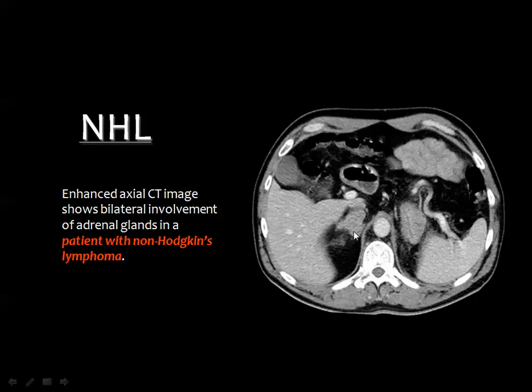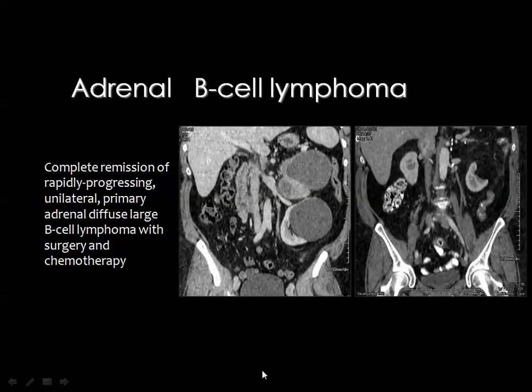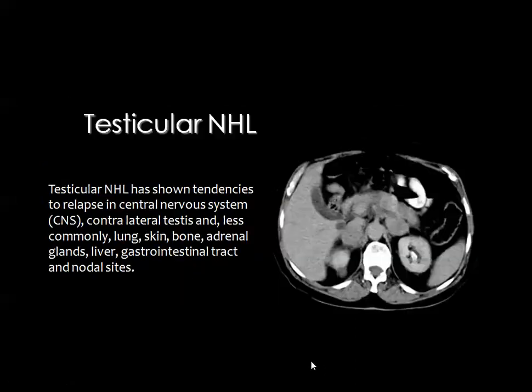And here you can see two bilateral suprarenal masses and the differential diagnosis. If you do not know that the patient had non-Hodgkin lymphoma, the differential diagnosis will include metastasis, pheochromocytoma, adrenocortical carcinoma, and so on. And this patient had an adrenal B-cell lymphoma proven by surgery. This is the tumor, and this is the kidney, where a simple renal cyst is also present. After surgery, the cyst has been evacuated and the tumor has been removed.